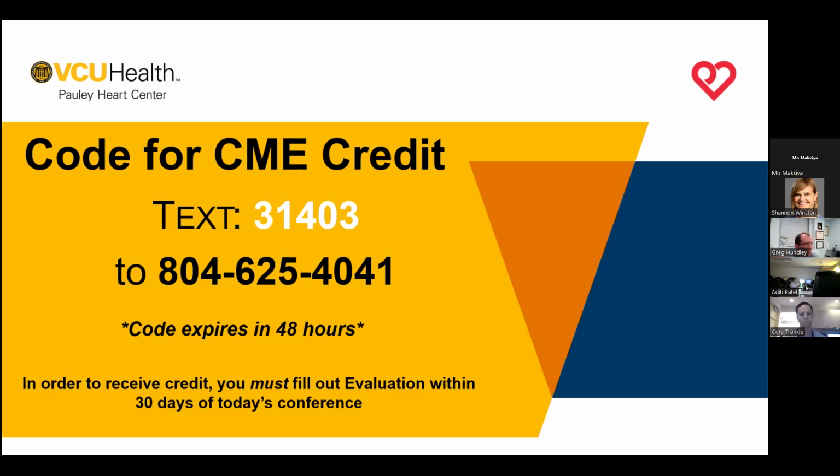Also, it depends on your lab. You have to have a standard for your lab. Most labs include papillary muscles, crista supraventricularis and all of that, and tendons. And if you don't include that, then you have to not include it on the left too, because this also may affect your measurements. So you have to have a standardized approach for your lab to work around it. And still with that, you can have some difficulty, mostly because of the volumetric measures or stroke volume measure of the RV.